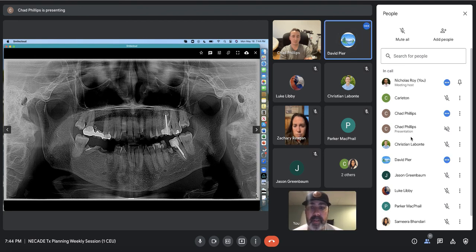Yeah, love it. I would agree. These teeth look stable. It doesn't look like there's pocketing on the distals of number 17 and 32. But those are the areas we want to look at with wisdom teeth. And like David said, if the patient is older and it's been stable, that's positive information for sure. The more data points we have, the better.